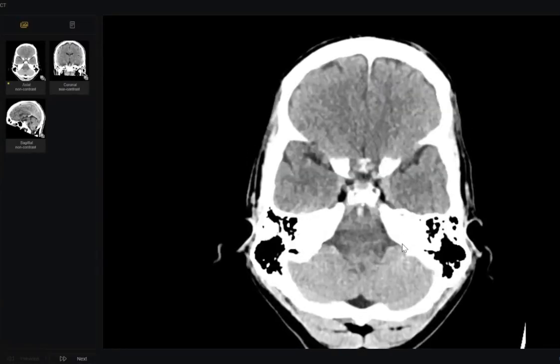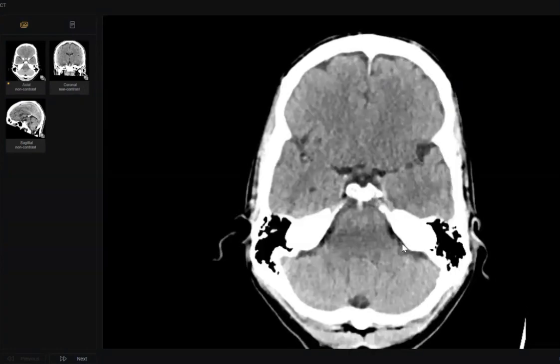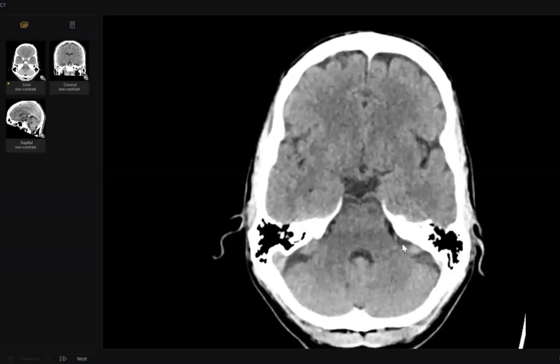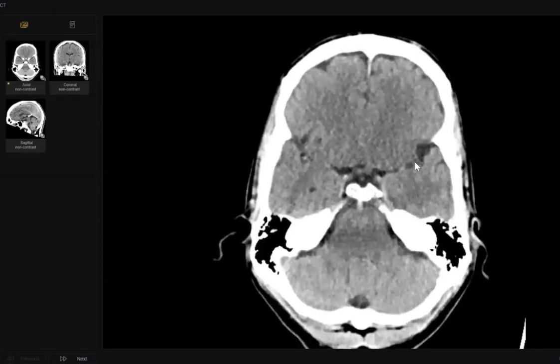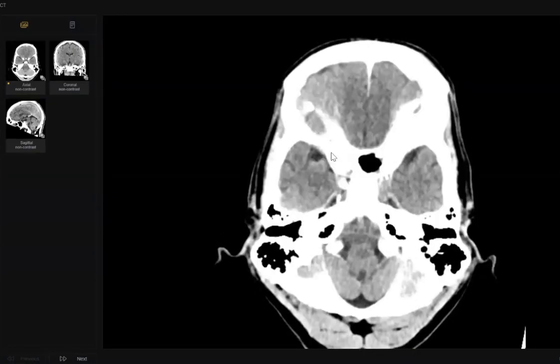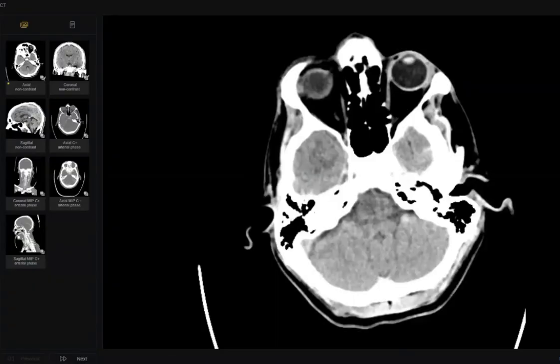Second point, even if you didn't know this rule, check your review areas. In old age with coma, you must tell the examiner whether there is any hyperdense sign here or here, the MCA dense sign, and the basilar artery. Like this, you smash the case from minute one. Whatever comes after that is a normal consequence.